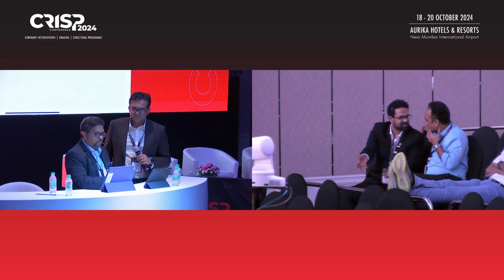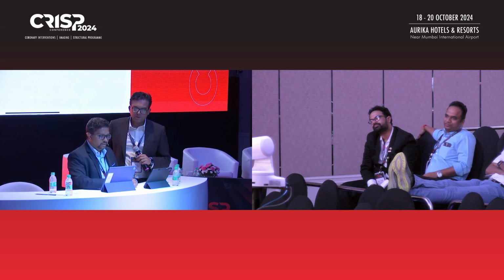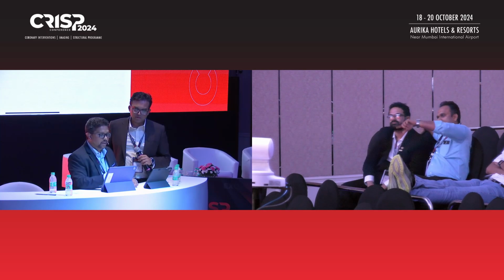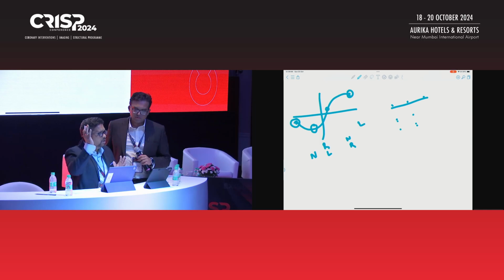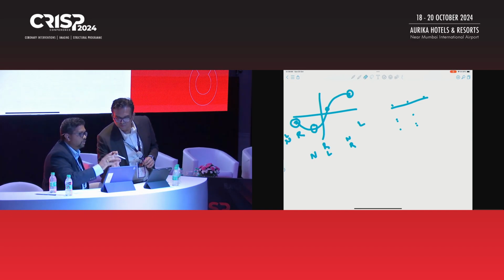So we know by pattern recognition now that somewhere here the non will be like this, and the right and the left cusps will be overlapping like this, and somewhere here the left will be like this, and the non and the right will be coming like this, and somewhere here, very deep here or very deep here, around 90 degree and very cranial or very caudal, you will have right like this, and the non and the left will be like this, because it is very cranial and very lateral also. One minute. So this is the first information.